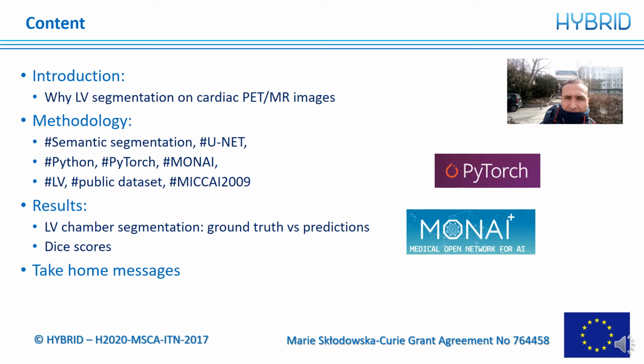So this will be the main content of the video. We will start looking at why we need a left ventricle segmentation on cardiac PET-MR images. Then move forward to the main part of this presentation. We will discuss the libraries, the dataset, the model, and the code used for this specific task. Then show some results, and I will share some personal opinions about this implementation.